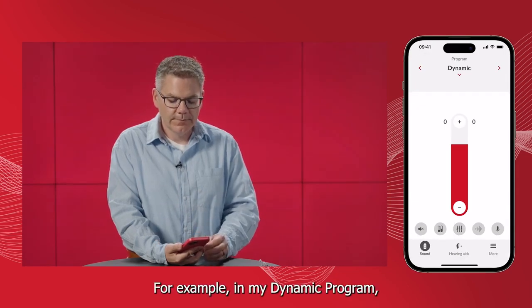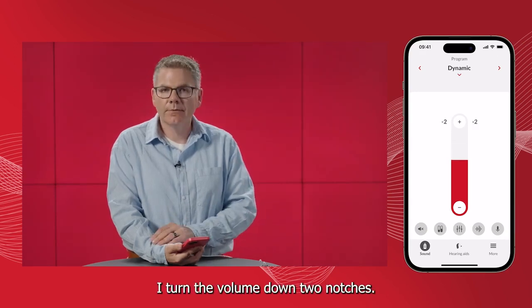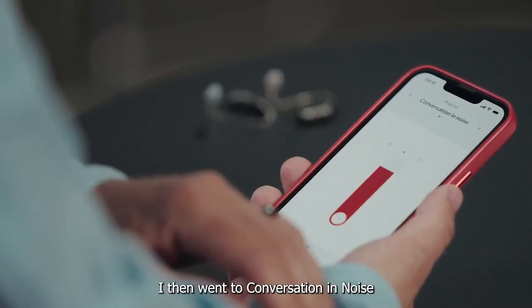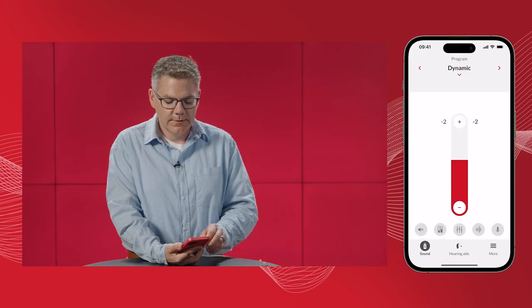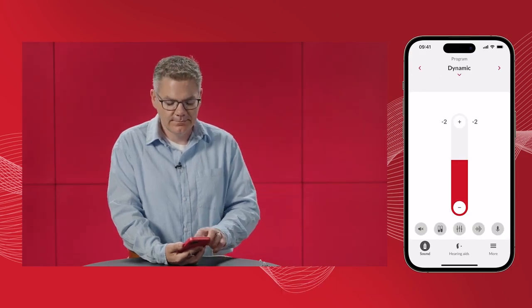For example, in my dynamic program, I turned the volume down 2 notches. I then went to Conversation and Noise, and then decided to go back to dynamic, and you'll see that my volume is still at -2.